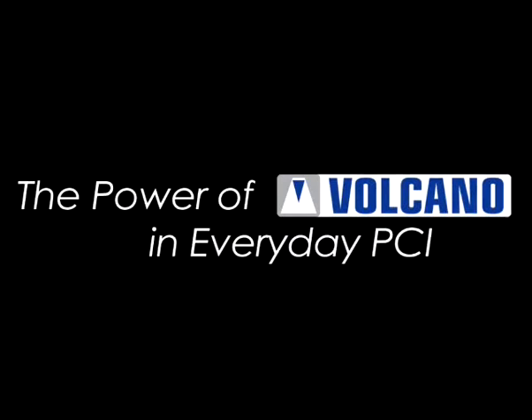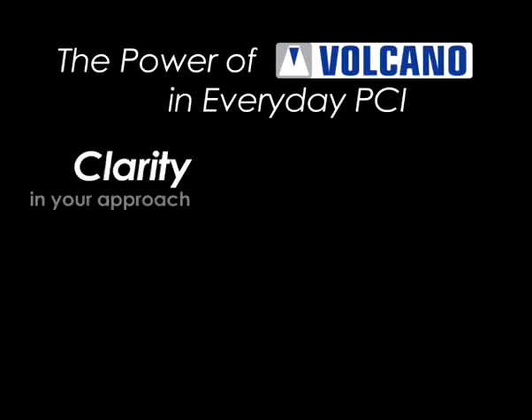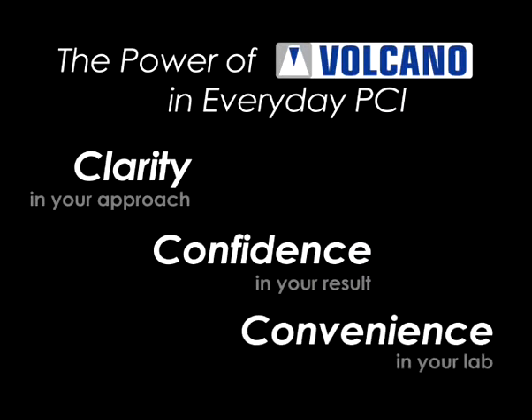Volcano, a leader in intravascular imaging and assessment, will help you realize the power of Volcano in everyday clinical practice. This interactive tutorial will help demonstrate how you can take advantage of fast, easy-to-use IVUS and FFR to deliver clarity in your approach, confidence in your result, and convenience in your lab as part of your standard clinical workflow.